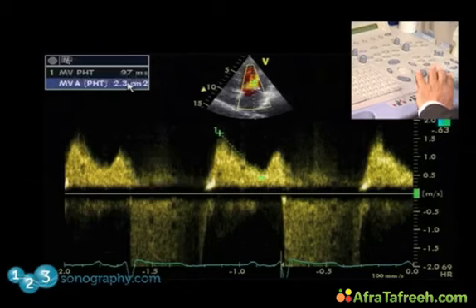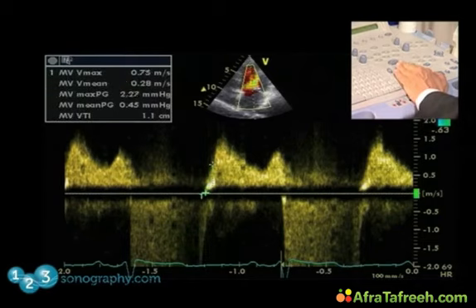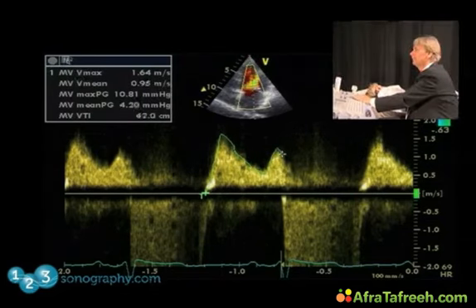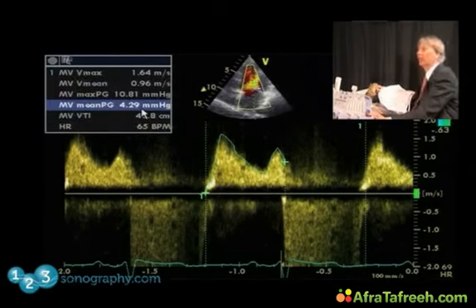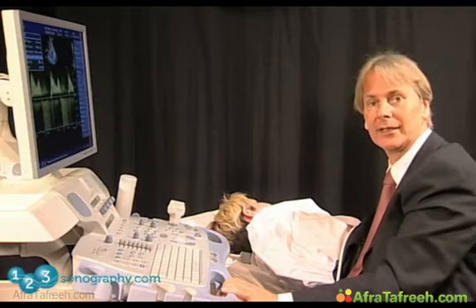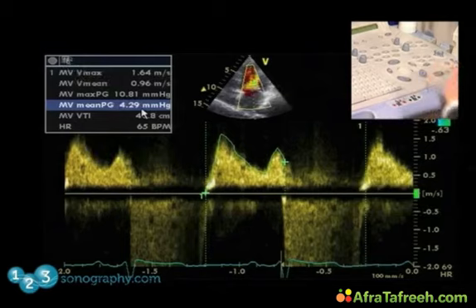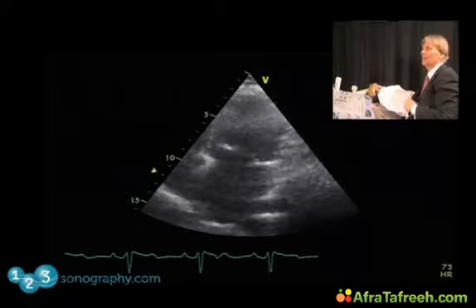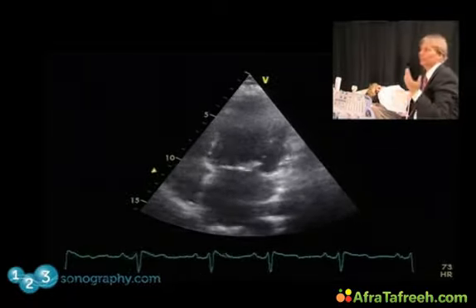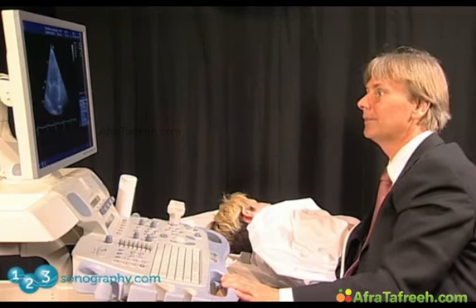significant mitral stenosis. The next thing we'll do is we'll take a look at the mitral valve curve and try to quantify the gradients. So I'll contour the curve here now. And look at the mean gradient, which is 4 millimeters mercury, practically no gradient. So in summary, this patient has a typical rheumatically affected mitral valve with rheumatic stenosis and with very low mean gradient and a mitral valve area above 2 square centimeters. So it's certainly only mild.